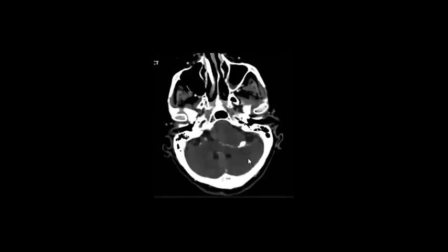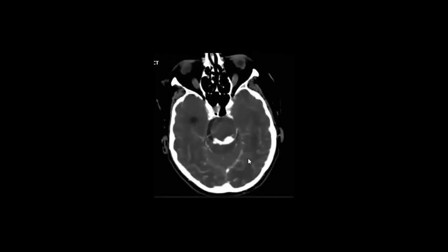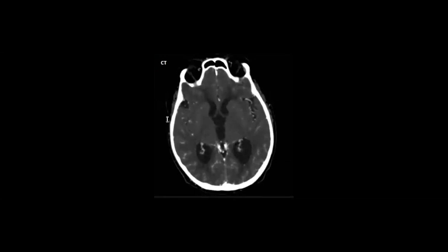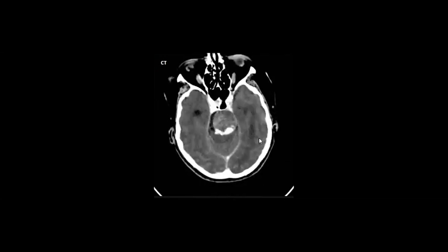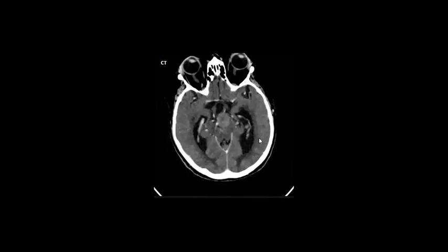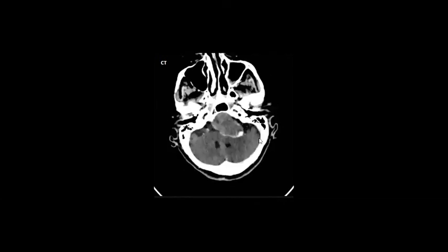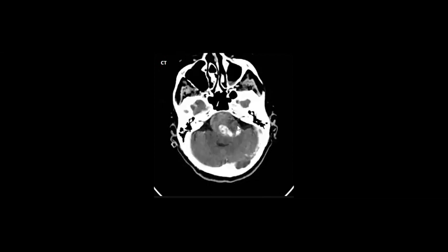Okay. Okay. I know it is not easy, but yes. Hassan. Hassan. I think it will be Hassan. I think it will be Hassan. This is the delayed image. Yes. Aneurysm. And so Hassan will be the first. Second will be Ala, because he mentioned first.